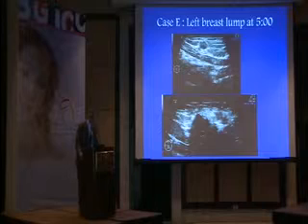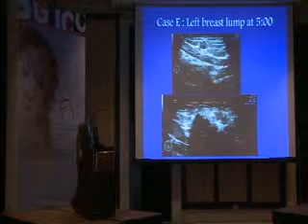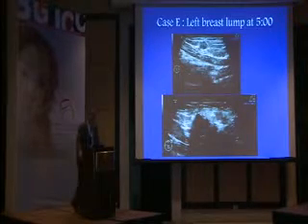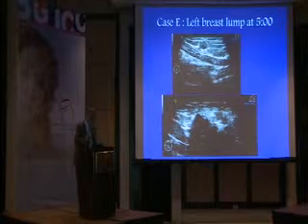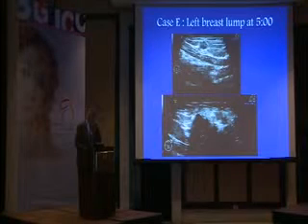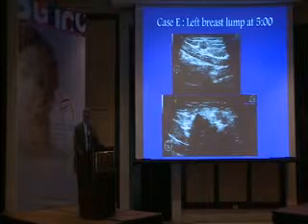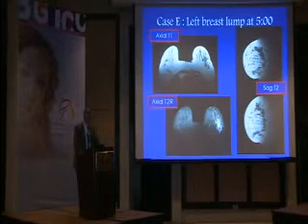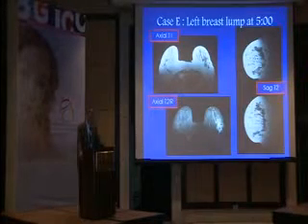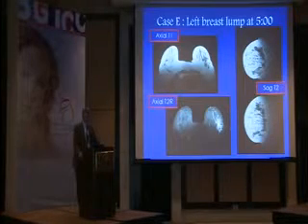So definitely the second step is just to do an ultrasound, and this was the ultrasound picture. There are two pictures here, one showing a small mass, the other at the bottom. What does it show? And this is the MRI. We have the axial T1, the sagittal T2, and the axial inversion recovery.